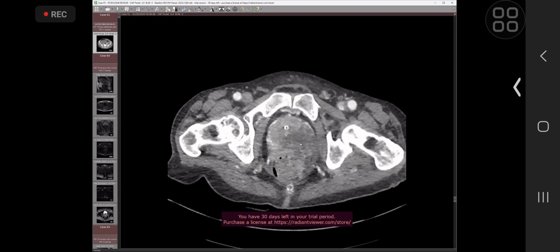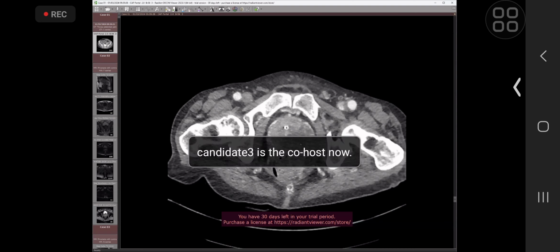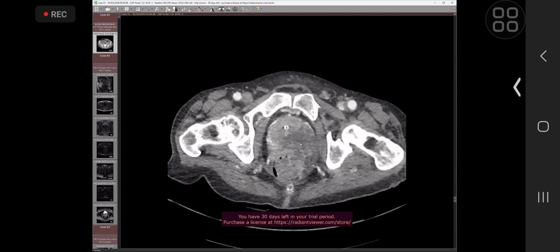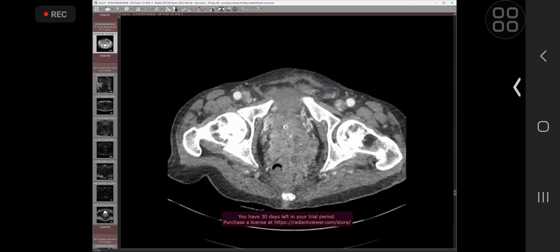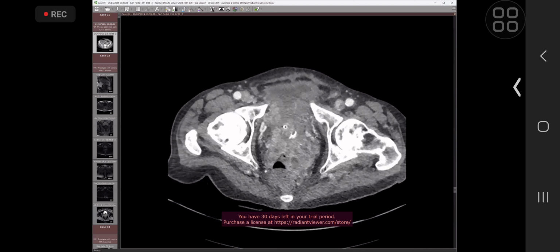Either way, an MR would give us more detail about the primary and might help us plan how we would get tissue, whether that's from a prostatic biopsy or rectal biopsy with sigmoidoscopy. So it can be helpful to decide that. It might not be straightforward to decide whether you want a rectal protocol or a prostate protocol, and perhaps you do an amalgamation between the two, or you add in the things in the prostate protocol that wouldn't be in a rectal protocol.